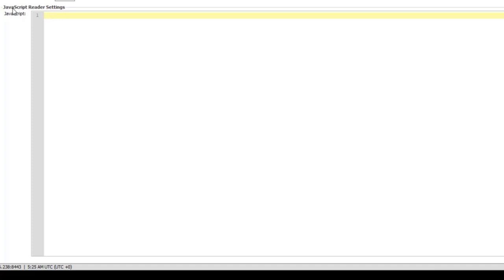Note that Mirth uses a JavaScript and Java hybrid called Rhino. This allows us to run JavaScript in Java, so we can access most of the JavaScript utilities and Java packages.